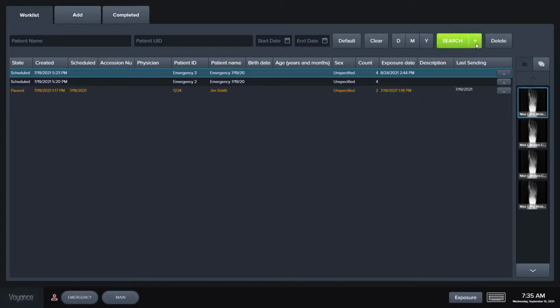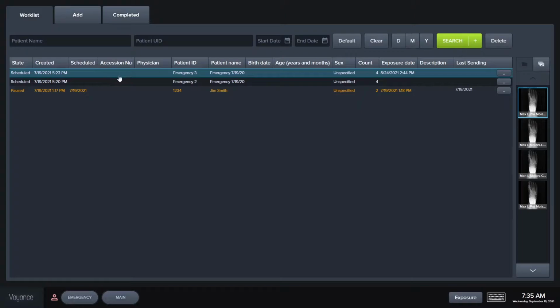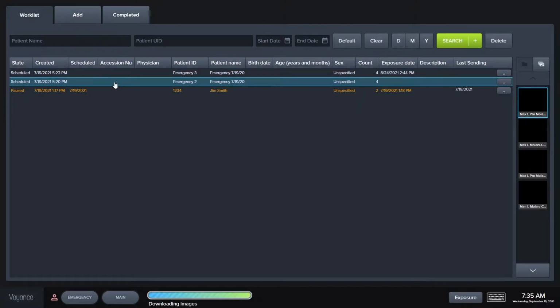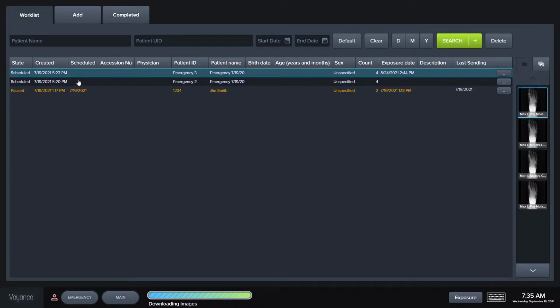You also see a plus icon on the search. If you click that, that just gives you some advanced parameters if you want to go more in depth. So what you see here in my Worklist, these are previous test X-rays that we were doing while testing the software. But this is how it will look for you when you begin working with patients. Okay, so let's get started.